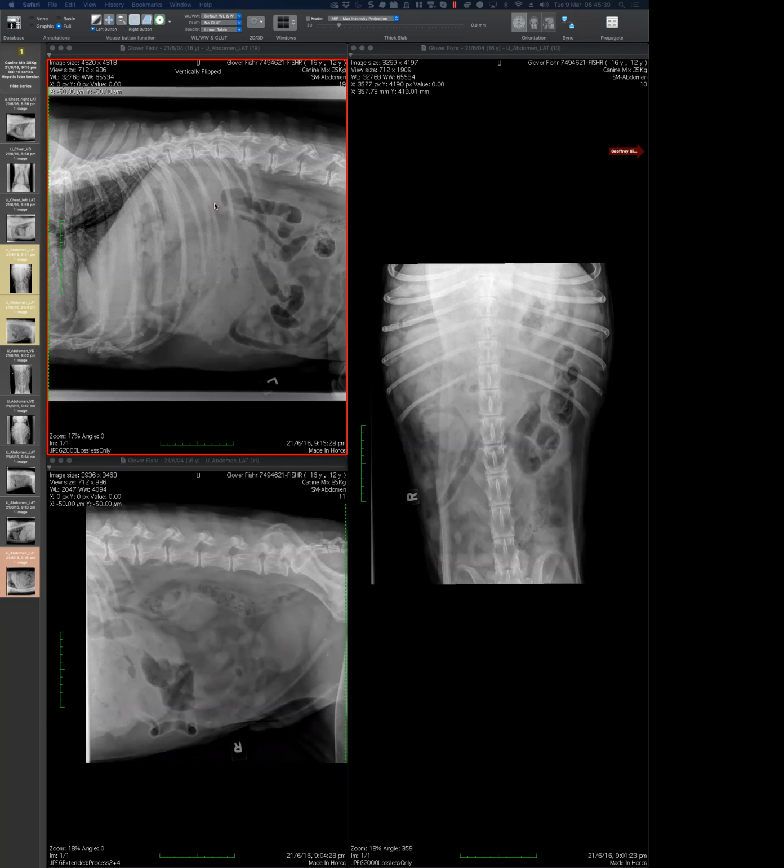Mariano, can you see the spleen in any of those x-rays? I think so. I think I can see it here. I don't know why sometimes the spleen doesn't go across the midline, and then we don't see it on the lateral, but I believe this is the spleen. Okay. But the idea of this being in the spleen is perfect. There's no way to argue against that idea in my eyes. So if you say, I don't want to remove the splenic mass, I would say, perfectly fine. You should not. Makes sense?